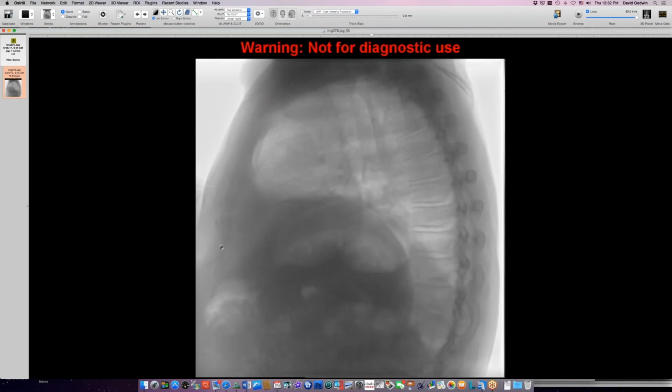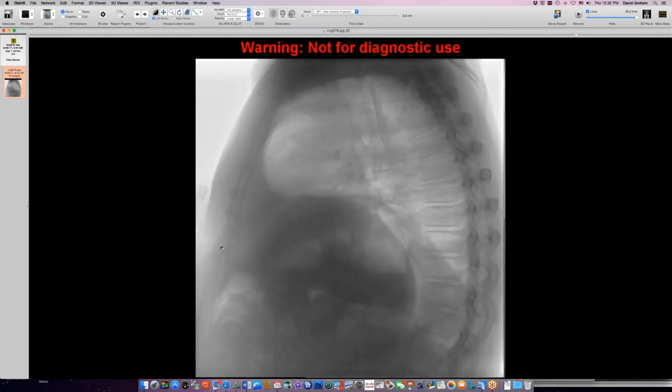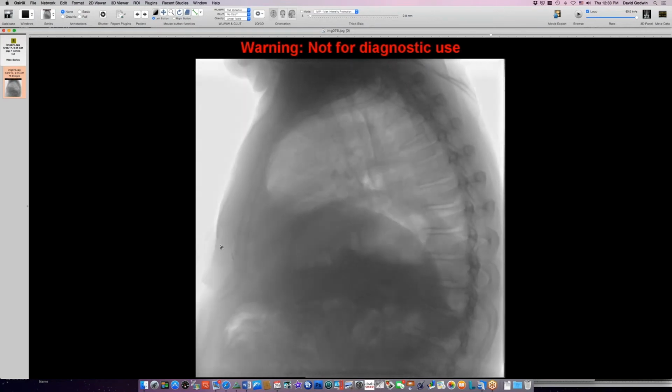So the lateral fluoro is very, very helpful in showing you that there is still very good orthograde motion here of the diaphragm, and this therefore cannot be paralysis. This anterior elevation here, despite its size, is just eventration. It's very large eventration, and despite the thinness of both crura, this is not paralysis. So lateral fluoro is very helpful here in distinguishing these large eventrations from paralysis.